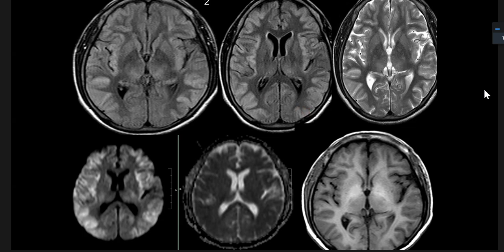What is your diagnosis? Occipital little spared, I feel. Excellent, very good. So basically you are seeing that the occipital lobe is spared. What happens to the basal ganglia and thalamus? Do you think thalamus is having signals? Thalami also hyperintense signal. Excellent. Basically, gray matter involving deep gray matter. Very good. So we have entire cortical restriction.